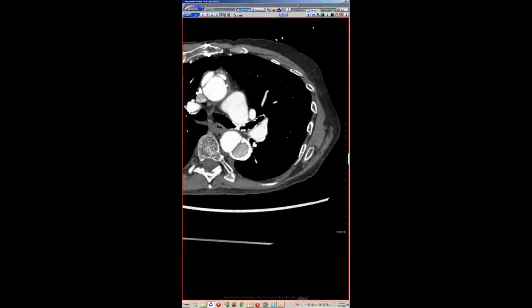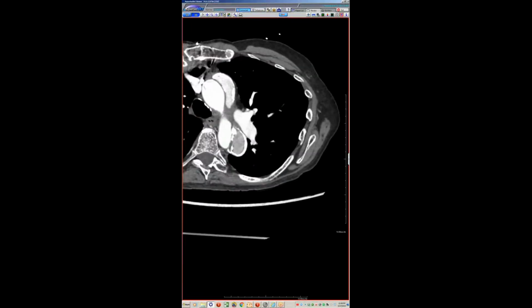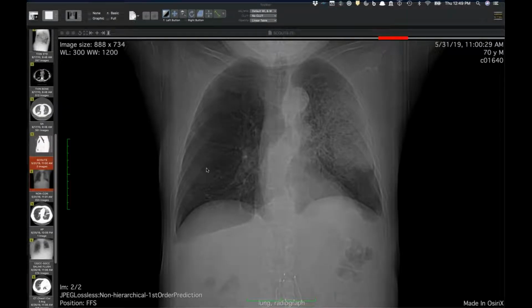Okay, those are my cases. Odd. Good. Travis, you still there? Yep. Good. Hold on. All right. Here we go. You see a scout from the CT.